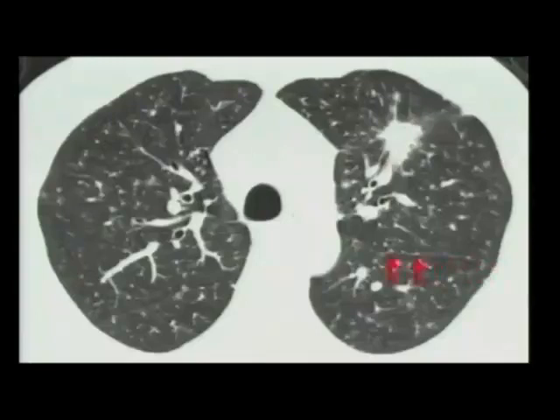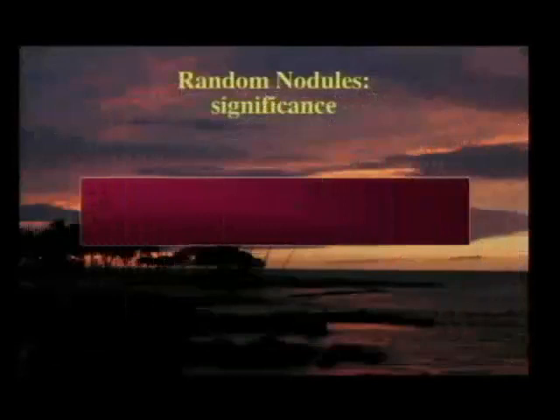Here is a patient with an adenocarcinoma involving the left upper lobe presenting as a 2-centimeter nodule. This patient has developed hematogenous metastases from this tumor, and you can see numerous very small nodules scattered throughout the lung parenchyma. Notice the presence of nodules at the pleural surface, typical of a random pattern, but again, there is no predominance of nodules in relation to the pleural surfaces. Diffuse and uniform lung involvement, typical of this pattern.